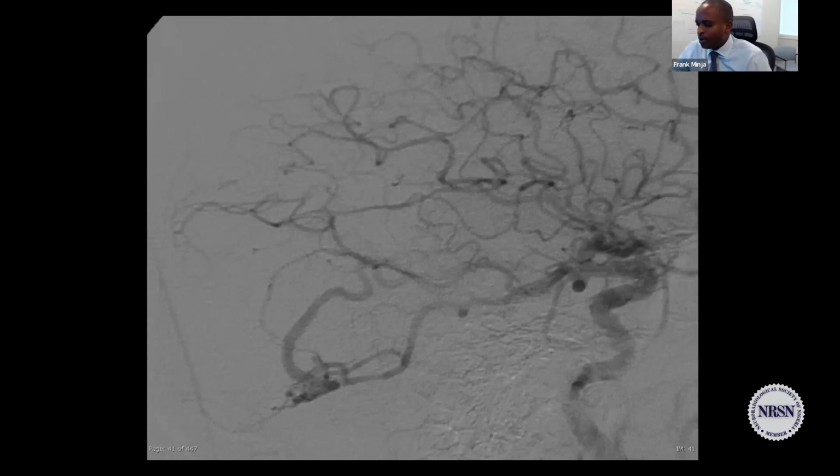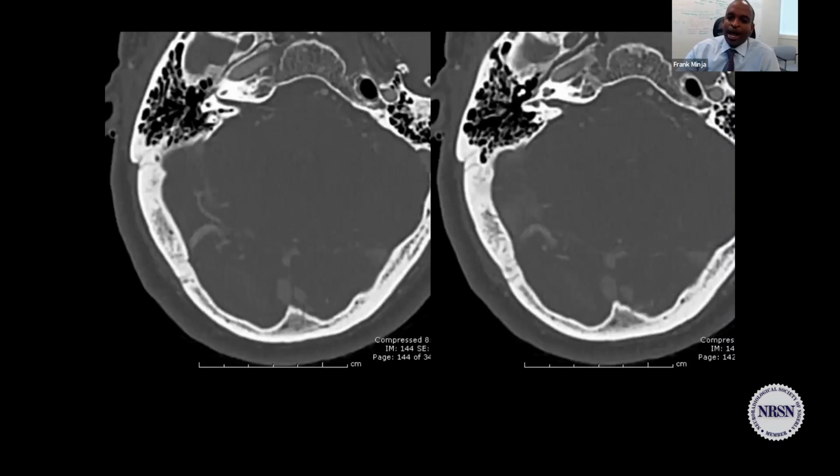What if you do not have an angio for this? My point is this prominent cortical vein, right? For a dural AV fistula, unless you're saying this is venous reflux, you would have to say that the dural AV fistula is in the sinus, and then this is cortical venous drainage. But look how circumscribed this is. Usually when you have cortical venous drainage, there's a lot more engorged veins, because the whole venous system is engorged.